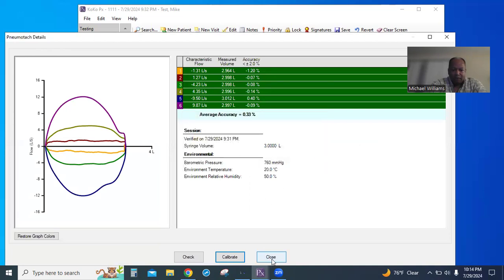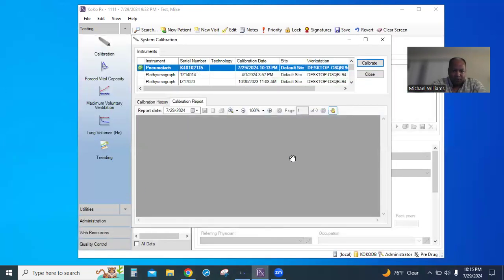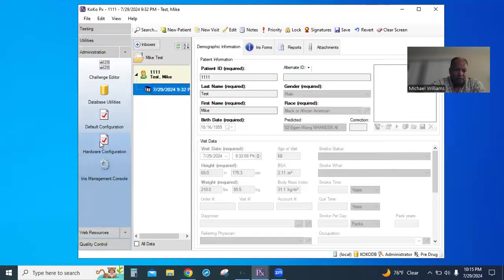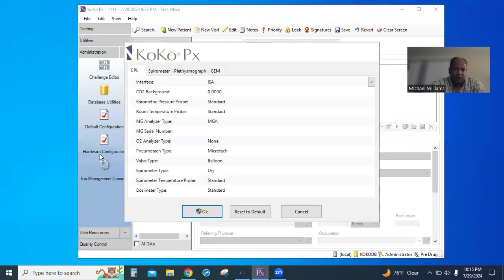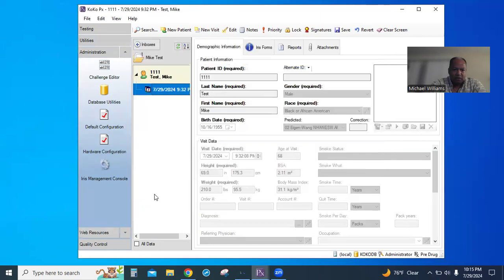Oh, let me back up here. Sorry about that. Let's see what's going on. Just make sure it sees our device. The hardware configuration, let's just make sure it's there. It is.